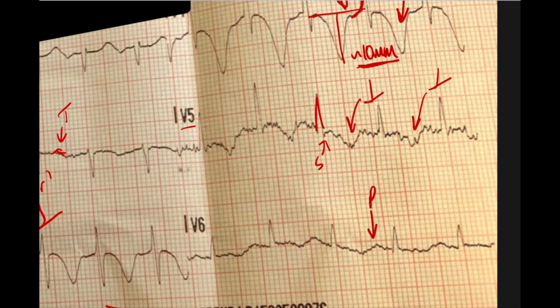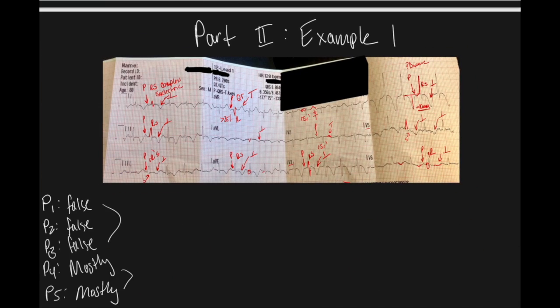Here we have the P waves, we have the little Q waves, so we have a QR complex, which is standard for V6, and it looks like we have still these T wave inversions, although it's difficult to see with the wavering baseline. So there's a lot going on in this 12 lead. So we have lots of inverted T waves. We have maybe some delta wave.